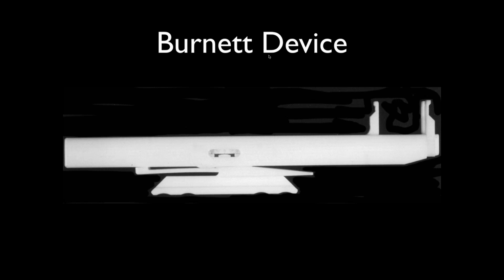And this was the Burnett device. We did that for maybe 5 to 6 years, and then we realized that really all the information we wanted could pretty much be contained just in the open and closed mouth views. So we stopped doing that maybe 20 years ago.